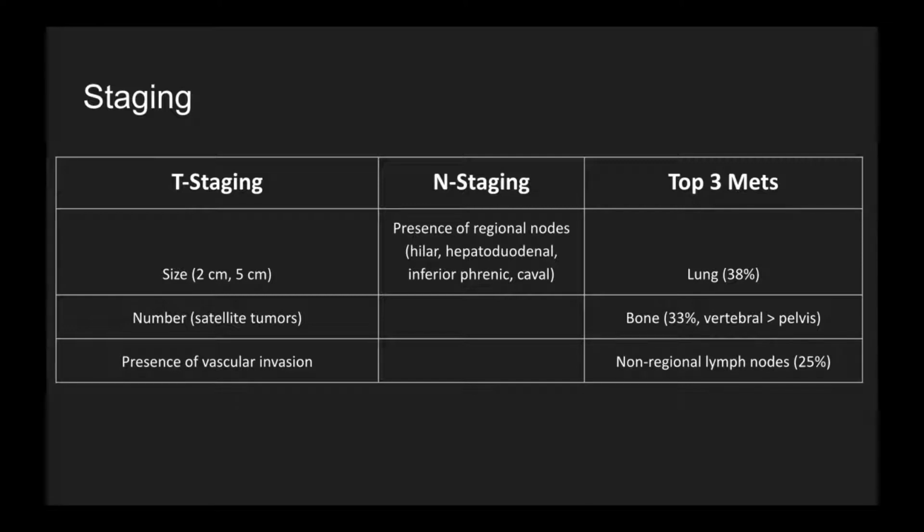That brings up the next point: look for vascular invasion. This is where the portal vein is going to be by far the most common, and you can actually see that on ultrasound. A good sign of that would be showing an arterial waveform in a thrombosed portal vein with Doppler ultrasound. That shows that it actually is tumor thrombus and not bland thrombus.